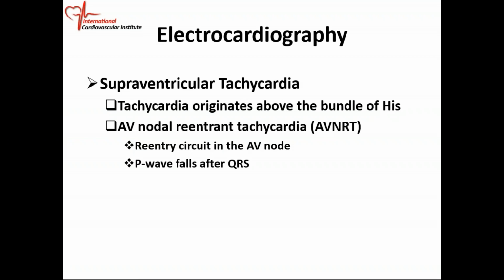All right, so we looked at PACs, PVCs. Okay, now we're going to look at tachycardias. And anything above the AV junction we call supraventricular. Anything below the bundle of His we call ventricular usually.